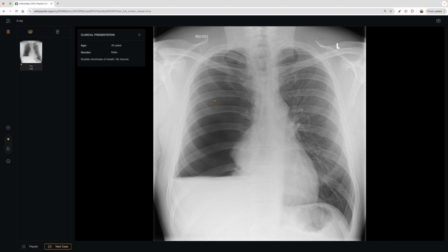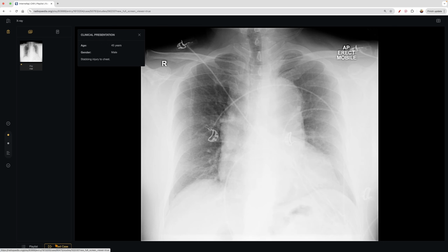thoracic cavity is pneumothorax. And then you see here, very flattened. And this is going to be a fluid accumulation. So there's a pleural effusion associated with this. And this is how you get a hydropneumothorax. So we're combining our words together. And then you can see the lung is all squished up, atelectatic or collapsed just from all that pneumothorax, all that air. And then they potentially have a tension pneumothorax and could be decompensating.